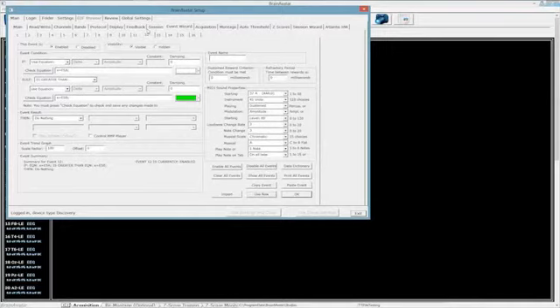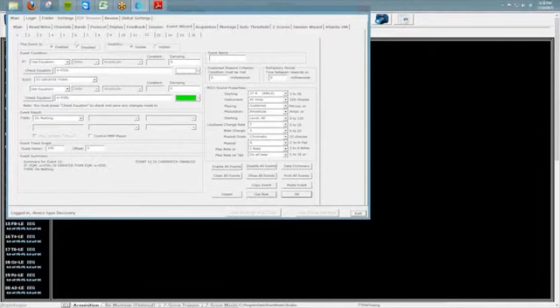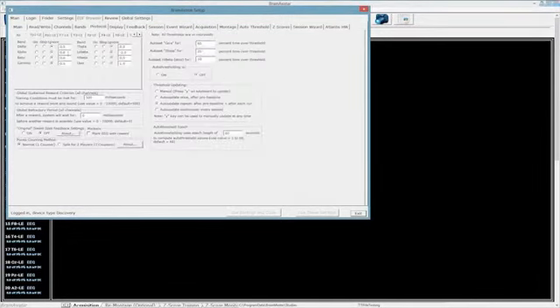Now, a lot of those games work off of the classic amplitude. So we're back to this page right here. Protocols, goes, stops, ignores, and so on. Using this, how does it know what a Z-score is? It doesn't. It knows what delta is. It knows what delta threshold is. It knows what these things are. BrainMaster thought about that ahead of time. We made it so that all of those third-party softwares are controllable with our advanced Event Wizard system.